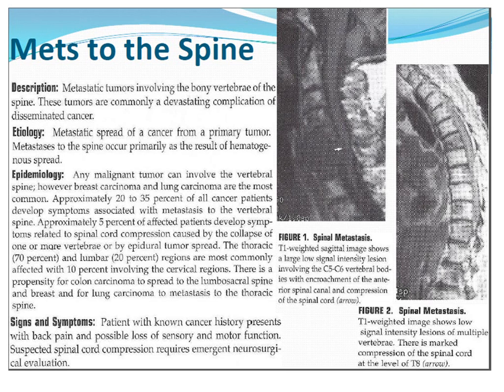You may be frequently evaluating patients who have a history of cancer and new onset back pain, weakness, numbness, all those same symptoms. You'll be evaluating them for metastatic disease, and typically you'll want to give contrast with these as well. The tumor can be confined to the vertebral bodies themselves if it's just a bone metastasis. They can be solely within the canal or in the cord, or it can be a combination of both.